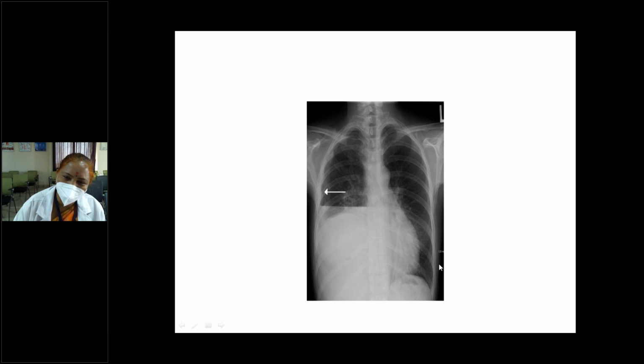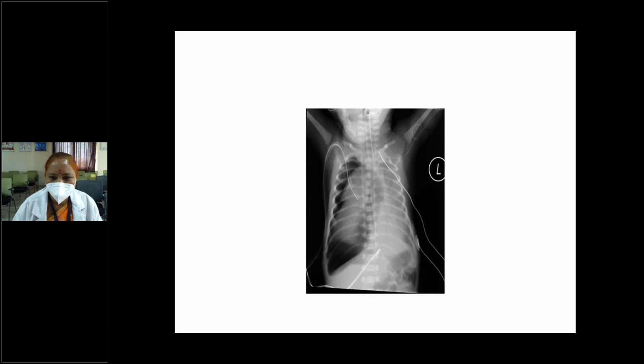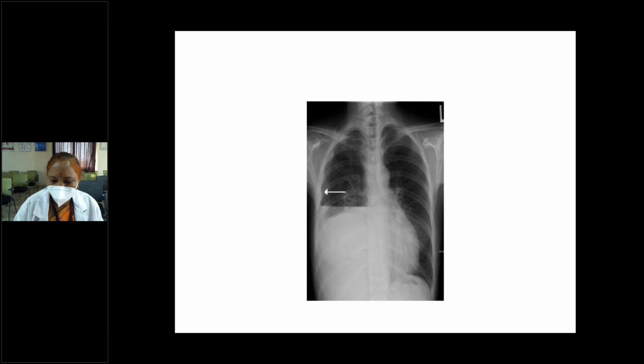Compensated hyperinflated left lung with right-sided hydropneumothorax. Okay. Yes, ma'am. Right-sided hydropneumothorax with clear hydropneumo or pyopneumo. We can't say.